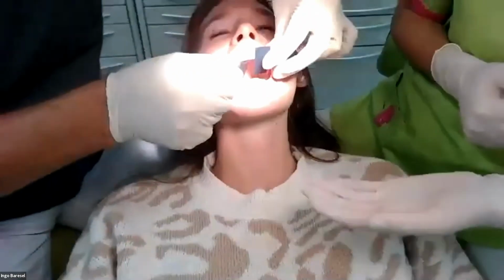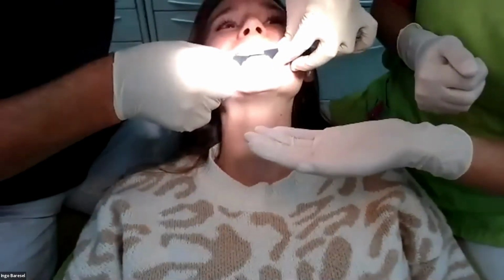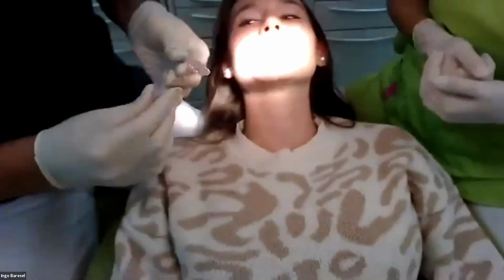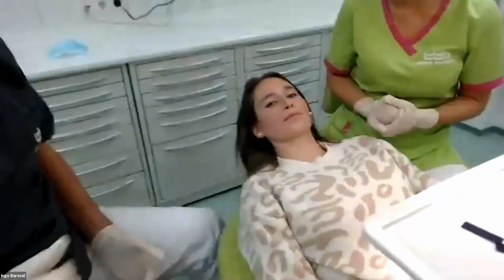So, okay, let's see, yeah. Okay. So if we look at the contact points, it's exactly what we expected from a splint.